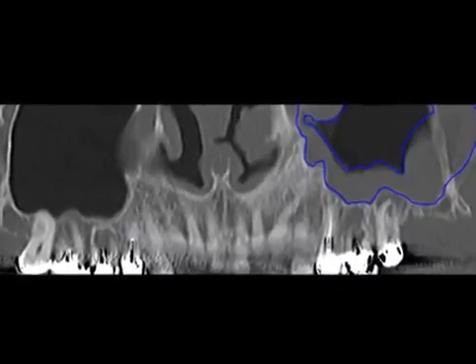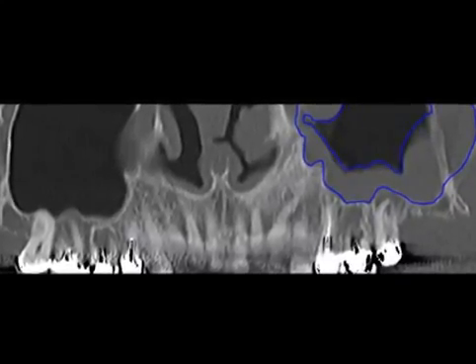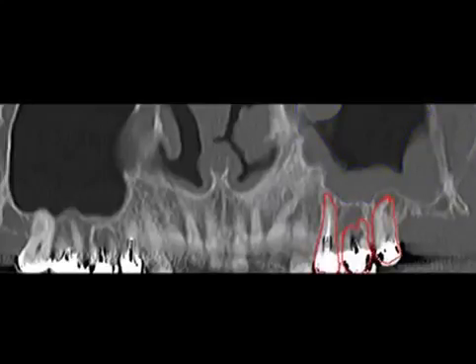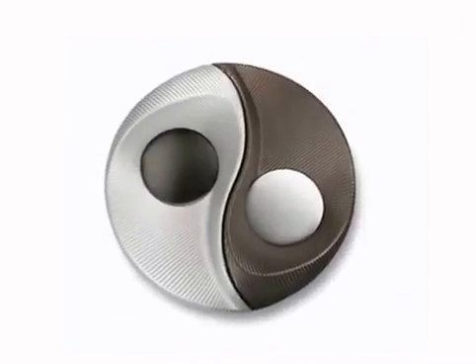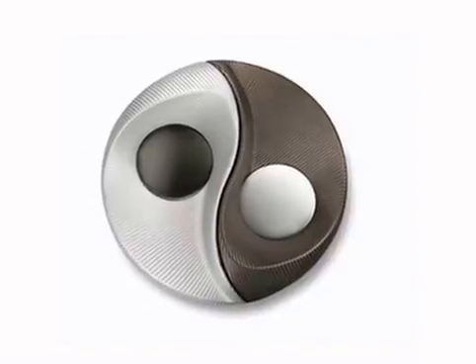Here you can see a shadowy maxillary sinus, meaning that the maxillary membrane, unlike the other side, is much thicker, shown in blue. This indicates an infection of the maxillary sinus, caused by molars, shown here in red. Molars often protrude into the maxillary sinus with their roots, or are very close. So if the dental nerve dies and this goes untreated, then the inflammation in the bone, shown in green, may cause an infection of the maxillary sinus due to the anatomical proximity. As you see, an X-ray is a shadow play, as are many things in life.